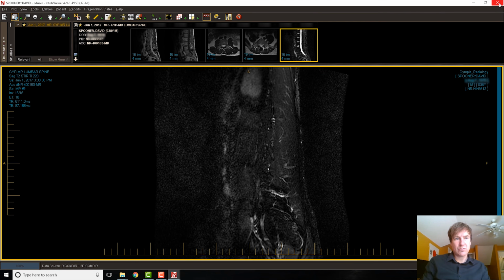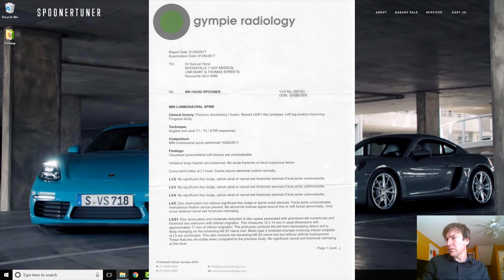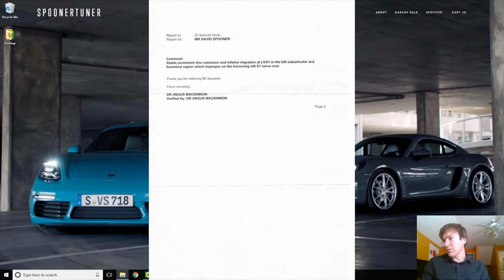Close this out, so we'll move on. And you can look at the report on that one now, and I'll pull up the next one.